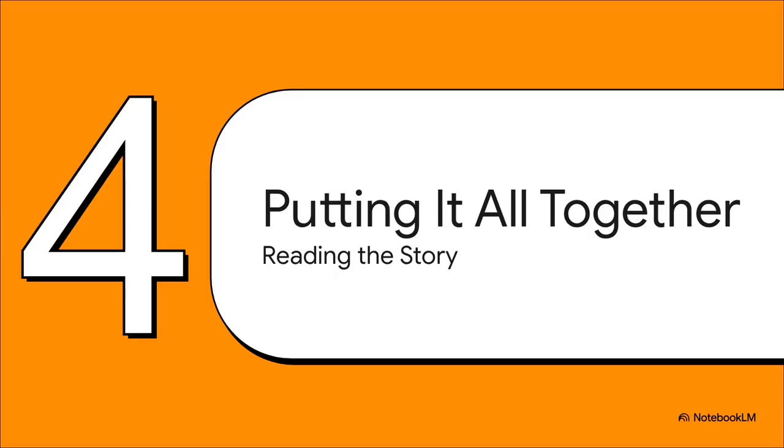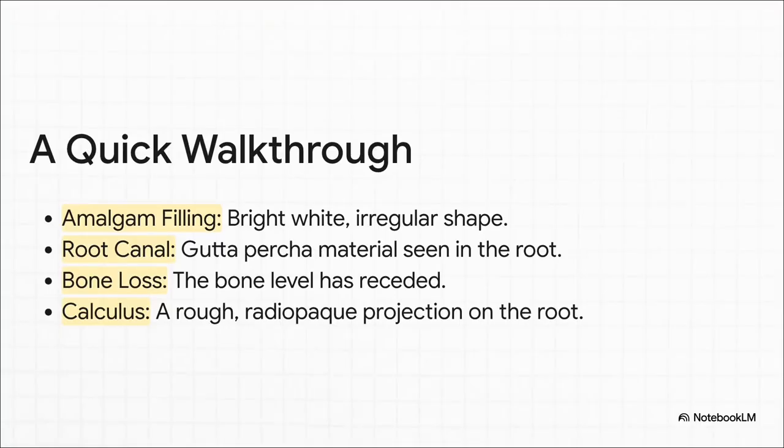Okay, deep breath. We've learned the language of light and dark, we've identified fillings and crowns, and we've looked for the sneaky signs of disease. Now it's time for the big aha moment. Let's put all these new skills together and see if we can read a more complicated story on an X-ray. Let's do a quick walkthrough.